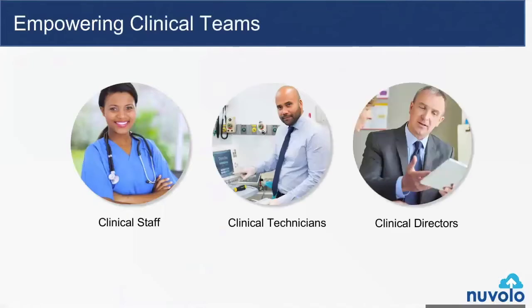So I'm going to get to the demonstration in a second here, but before I do that, I'm going to set up the scene. We're going to first take a look at what it would be like for your clinicians, your end user staff to interact with Nuvolo and how they would connect up with HTM teams to report an issue. And we're going to show you how to do that through the self-service portal in a couple of ways. Then we'll walk through the perspective of a technician. What is it like for a technician to receive a work order and process through it? And we'll show you that on the mobile app. And finally, we'll take a look at some dashboards we've created. So some of the reporting capabilities that we have for your clinical directors to make better business decisions.